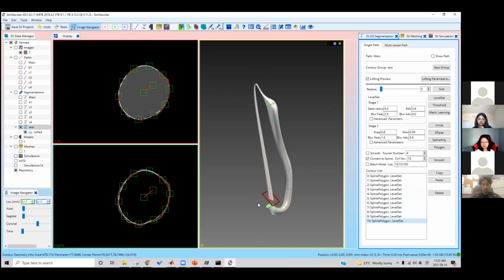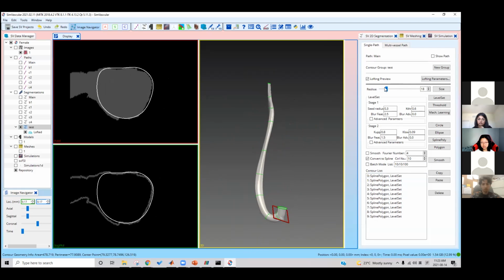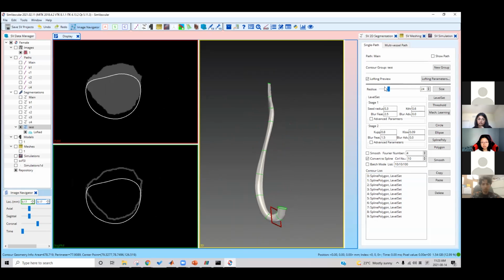This is because the first one that I did, it somehow interprets it to be the last slice instead of the first slice, so that's not good. I'm just going to delete that one and make sure everything still works. Okay, right now it looks pretty good. I'm just going to make sure it actually is what it looks like. So that looks good.